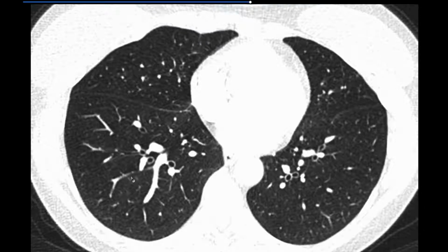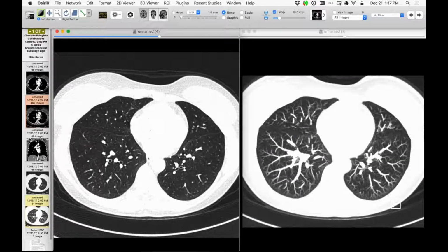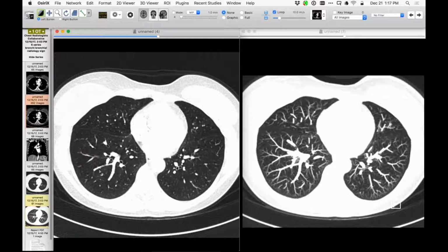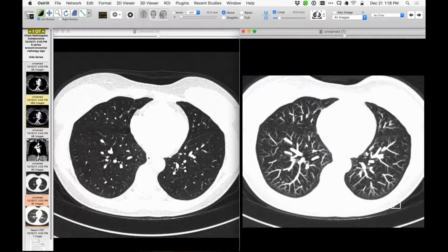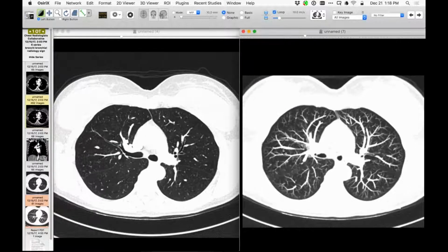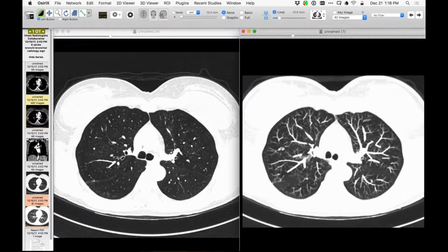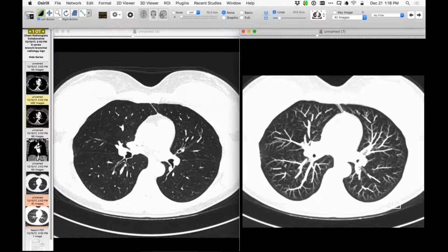And sometimes these go away and sometimes they don't, but I've never seen one subsequently enlarge and represent an endobronchial metastasis or so on. But the nice thing about knowing about this is the differential for small nodules on MIPs is intraluminal material in an airway. Do you encounter that much? Do you typically look at MIPs when you look at follow-up oncology patients, vexed with all the little nodules you see?